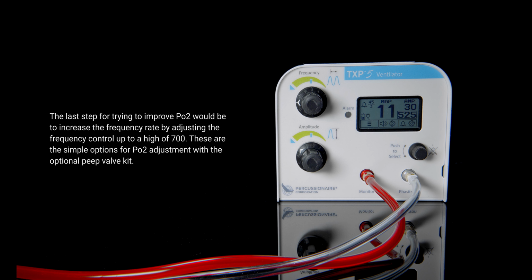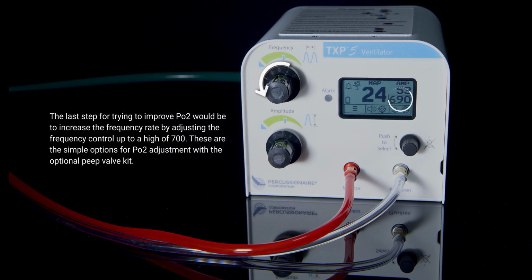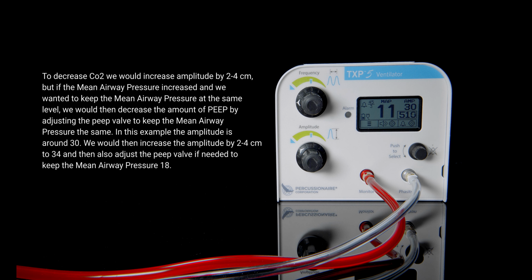The last step for trying to improve PO2 would be to increase the frequency rate by adjusting the frequency control up to a high of 700. These are the simple options for PO2 adjustment with the optional PEEP valve kit. To decrease CO2, we would increase amplitude by 2 to 4 centimeters.